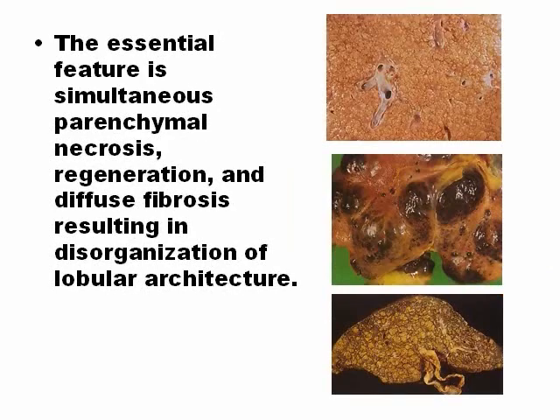The essential feature is parenchymal necrosis, regeneration, and fibrosis. Fibrosis is the final stage of the liver, and this is called cirrhosis, when the liver is fibrous tissue. No hepatocytes are there. No hepatocytes, no liver function can be accomplished.